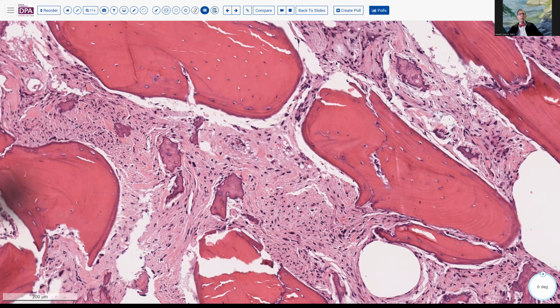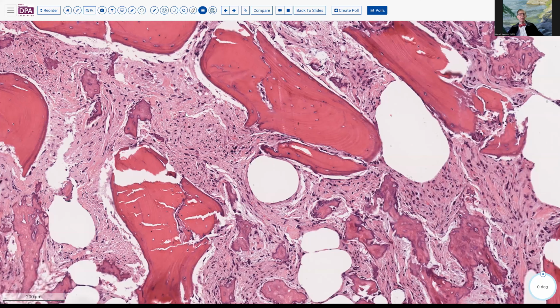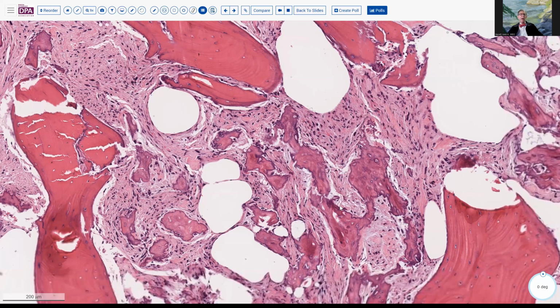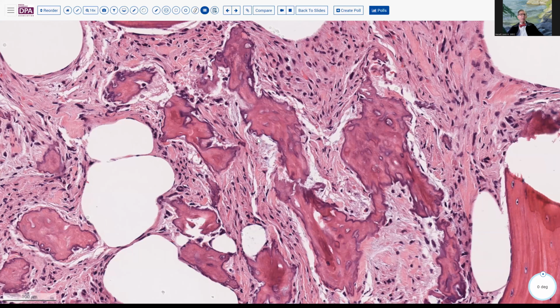And it is not necessarily an overwhelmingly difficult diagnosis to make, but in the setting of the potential consequences for the child, the individual, the family, and the relative infrequency with which many people encounter this disease, it can give the pathologist a little bit of pause, depending, of course, upon the quality of your biopsy and the cellularity of the tissue. If you see an area just like this, you may go, well, is this some sort of funny osteoblastic process, maybe an osteoblastoma or something of that sort?